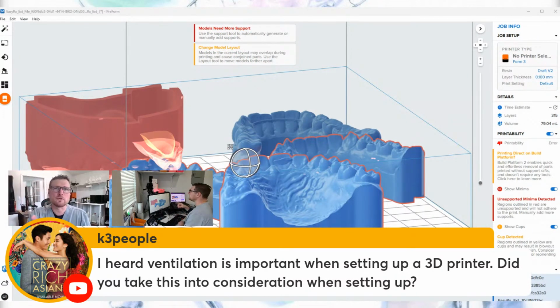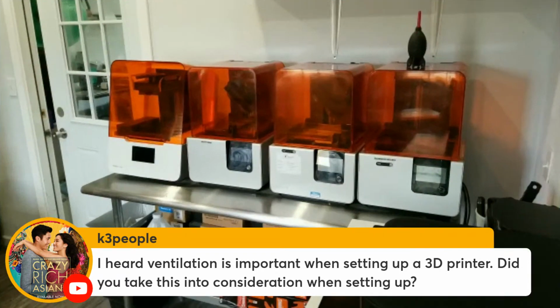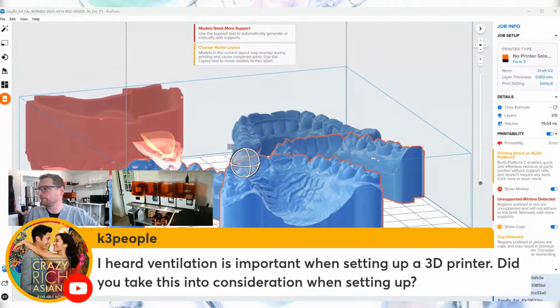Now, I will go over what I plan to do in the future. I do feel like you do need ventilation, and I'm going to put a through-the-wall ventilation over there. You can't even see it. Oh, here. There's my printers, and above it, I'm going to put a through-the-wall ventilation system. So, yeah, that's what we're going to do.